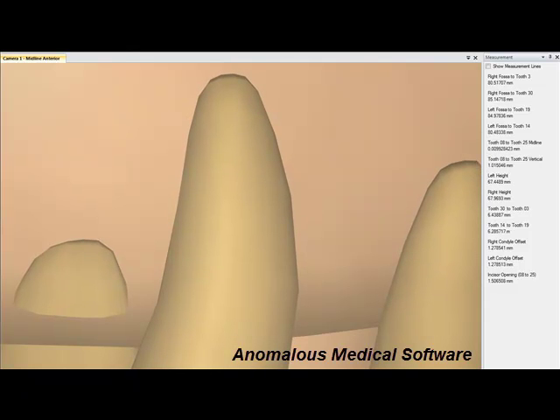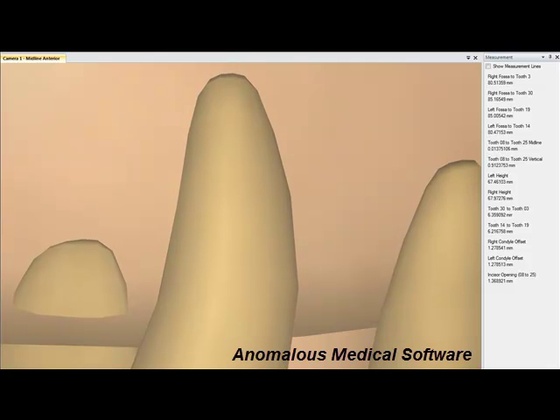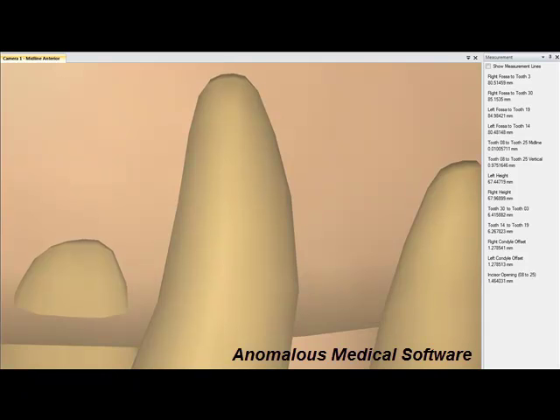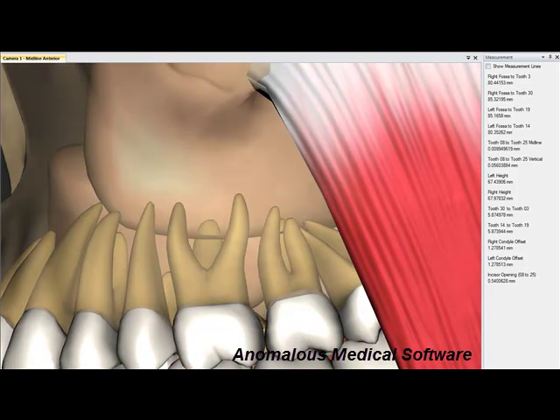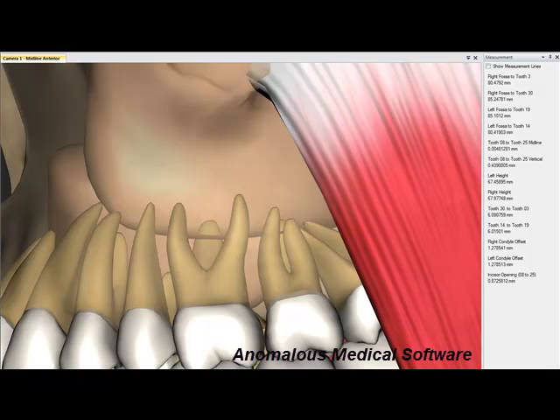And then with adaptation you can see the intrusion going on in the molar apices. Let me take it back again. And then as we're adapting, I'll go ahead and hone out on this so that you can see the changes that are occurring. Again, non-adapted, and then the changes that are occurring with adaptation.